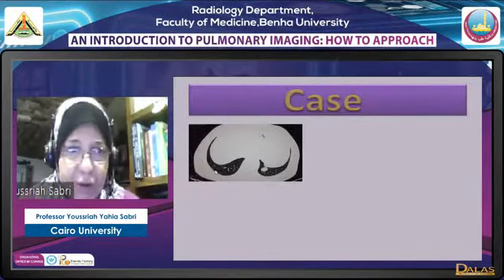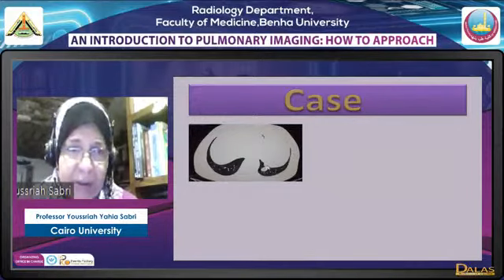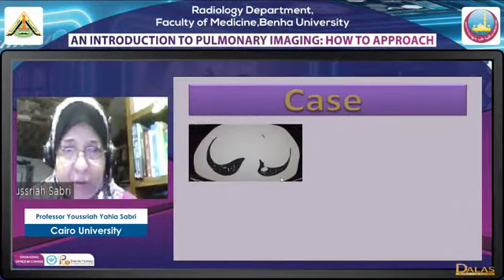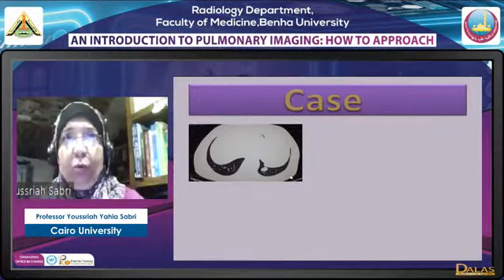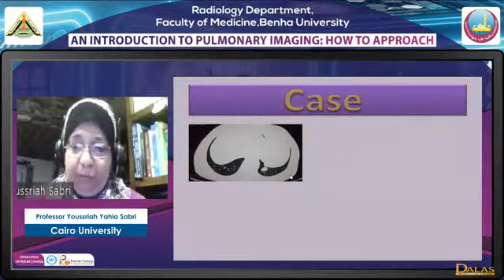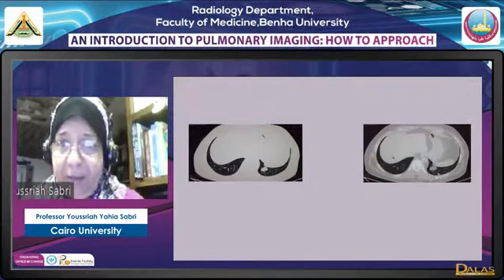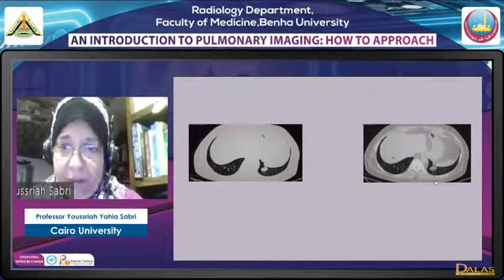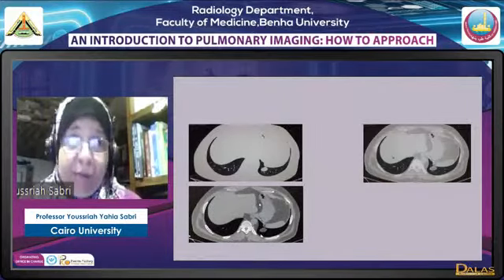Again, this patient had high resolution CT, and we incidentally discovered this left basal nodule. High resolution CT is not supposed to assess masses and nodules. So we changed the window and started examining the lesion by a normal lung window. We found that the content of the lesion suggested fat. So we shifted to the mediastinal window. Okay, there is fat. Are we dealing with a hamartoma?